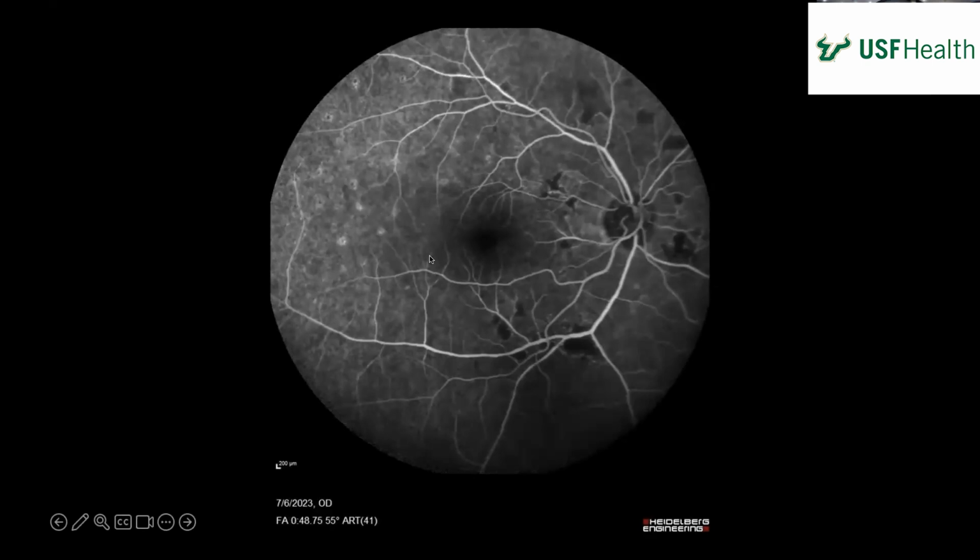Yeah. So the hypofluorescence, there's 2 causes, right? There's either the vascular defect and then blockage. Good. And what do you think those are? I thought initially there was heme there, but I think I'm confusing with where the cotton wool spots were. So I think the window or the vascular. I think they're cotton wool spots. Oh. But it's interesting with cotton wool spots. They don't perfuse, but do they block?